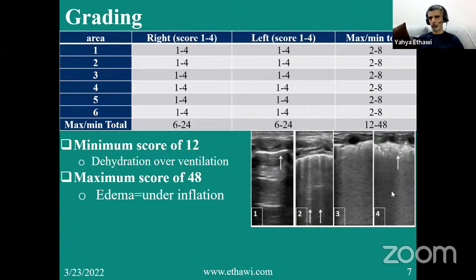But sometimes I agree with you, you can say it's a 3 to 4. You can't always have a clear definition, but once you do more, it will be clearer. They are almost close to each other, but you'll find it easy to find a 4 and easy to find a 3. Sometimes you cannot, so you can see it's somewhere between a 3 and 4.